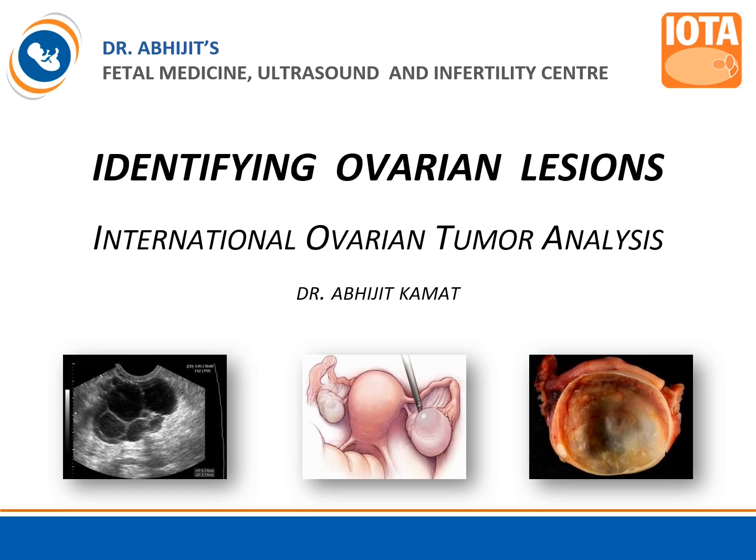Welcome to this module on identifying ovarian lesions using the International Ovarian Tumor Analysis, or the IOTA system. For a change, we are not going to talk about the fetus, but we are going to talk about ovarian masses, which we can frequently encounter in gynecological as well as obstetric scans. And we are going to try to use the IOTA system to make a reasonably accurate guess whether the ovarian mass is a malignant one or a benign one.